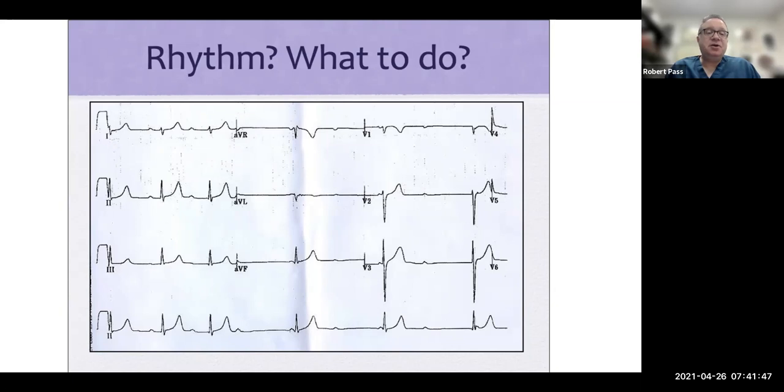In fact, I believe I'm an author on a paper by Chris Jansen in which we basically found nothing. And so that stopped the process of just blindly echoing everybody who had an ablation. There are people who need them, but it's unusual. But anyways, the point is, yes, we're post-op day 0 or 1 after an ablation, and this is what you're seeing. This is clearly a suboptimal finding. So is there anything you could do about this, or what would you do?